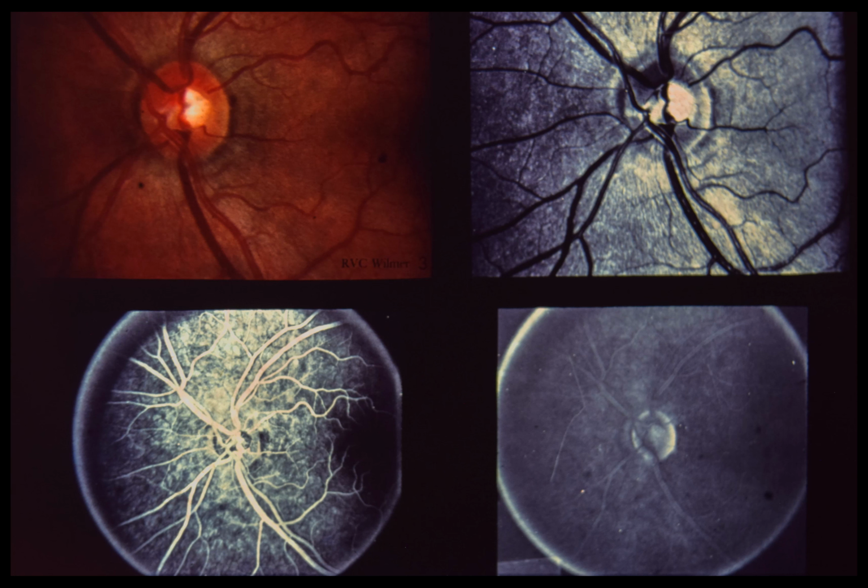This 34-year-old male has a normal eye examination. Upper left. The disc is pink with a small, round central cup. Its margin is well defined. Superficial disc vessels and peripapillary retinal nerve fiber layer striations are clearly visible. Upper right. A red-free photograph at 2x magnification shows the fine striations of the normal peripapillary retinal nerve fiber layer.